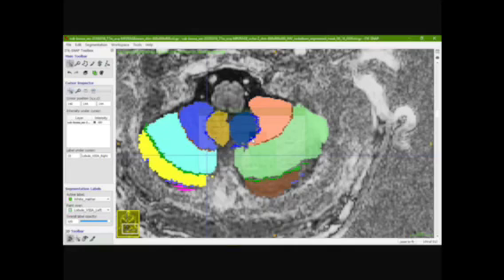So this is going to create a different file every single time that you save the labels. So it is very important that every single time that you finish working on a mask and you have created new labels and used those labels to segment new anatomical lobules or regions from the brain, you save those labels, as you're going to have to use them in the future.